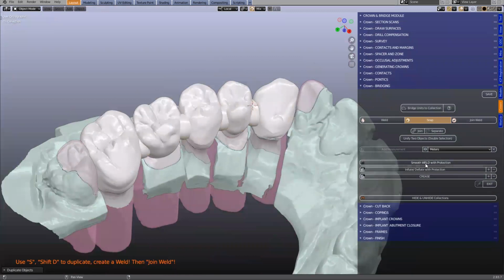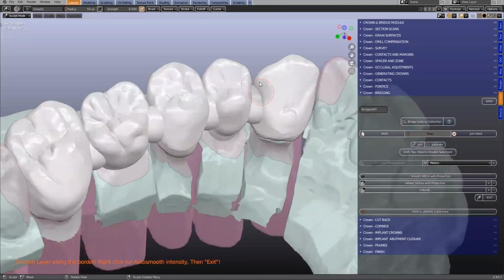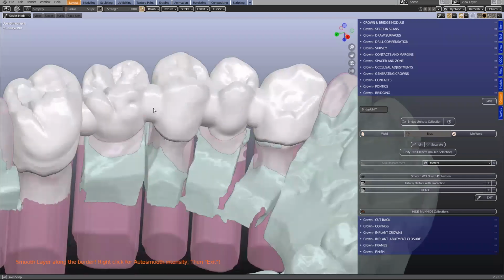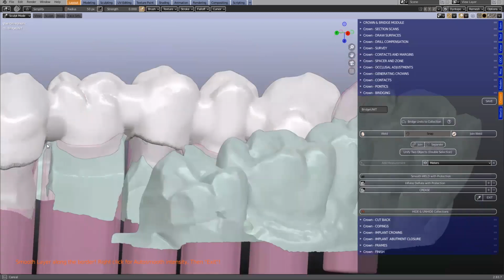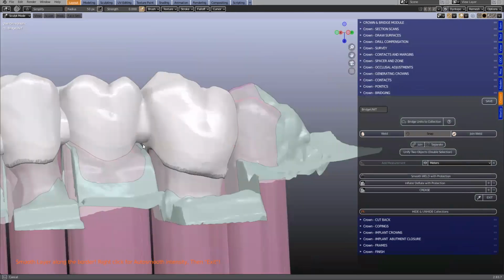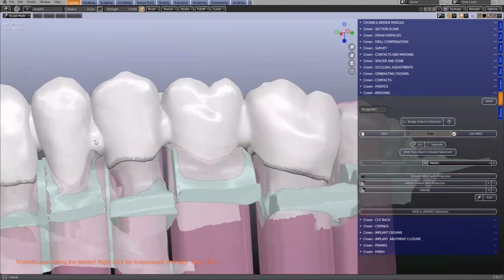And then once it's joined, we're going to select and smooth this weld. So it follows a completely logical procedure path. Let's just smooth it nicely like that. We're going to go on the inside here a little bit like this. So those gray areas are all protected zones at the moment.